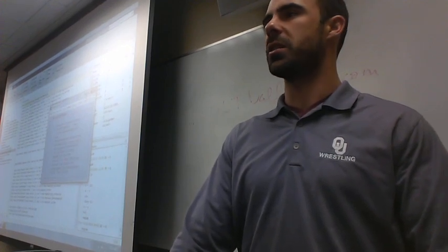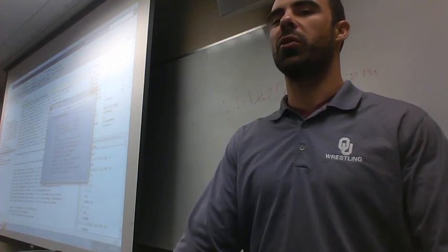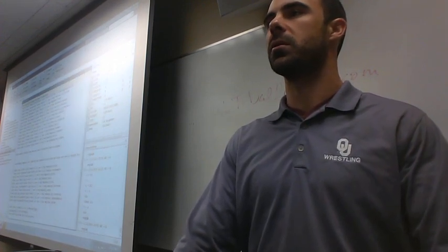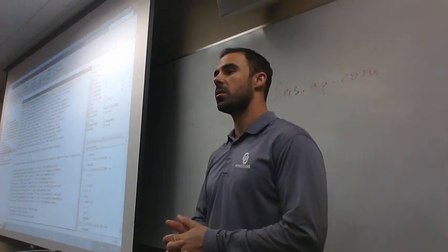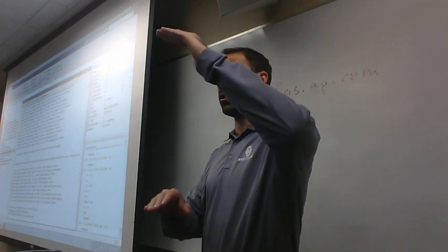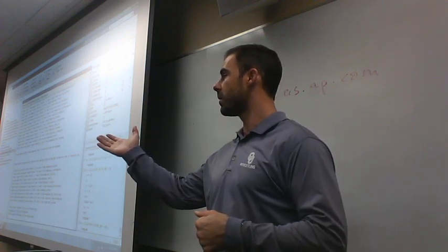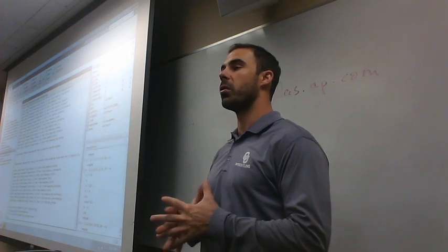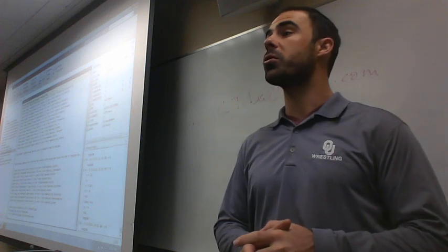While our downloads are working in the background, I want to show you guys a couple shortcuts, a couple little tricks. So what are some other commands that we learned to type into the command window here last class? CLC. CLC was one of them. What did that do? It cleared our command window, right? And then somebody said clear all. Who said that? Yeah, okay. So what did clear all do? It cleared everything in our workspace.